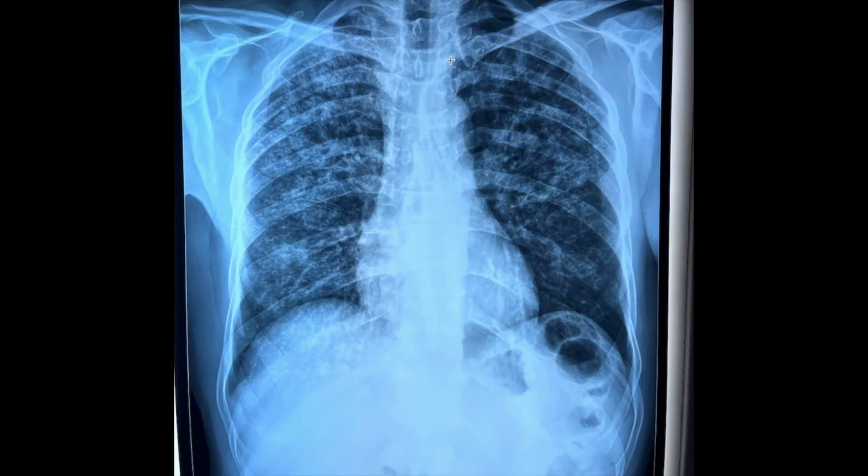What about this X-ray? What is the obvious thing in the lung fields here? The mediastinum is central. However, there is extensive reticulonodular opacification in upper, mid, and lower zones bilaterally with cystic changes within. This could mean a fulminant viral pneumonia, like COVID. It could be present in acute interstitial pneumonia. It could also mean long-standing tuberculosis, pulmonary tuberculosis, with bronchiectatic changes inside.